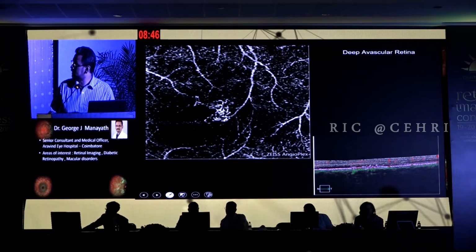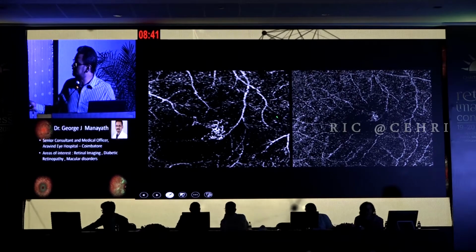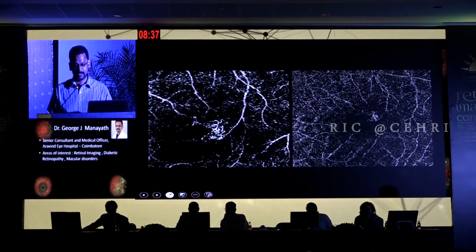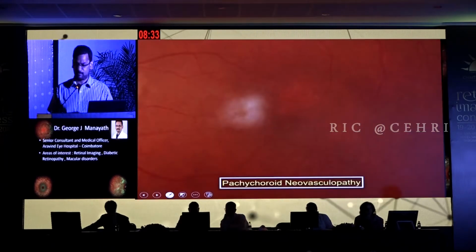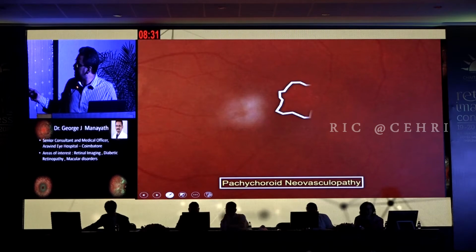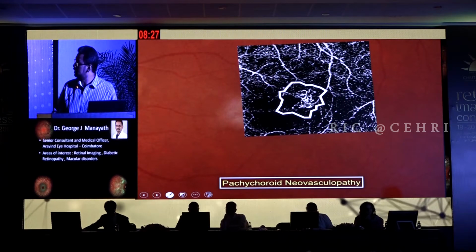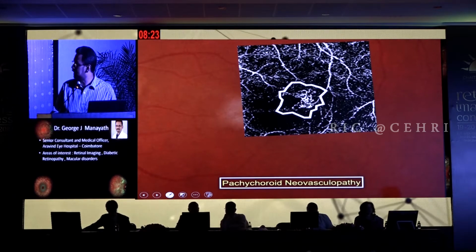The avascular retina shows this choroidal neovascular membrane, and these are 3 mm and 6 mm slabs of OCTA showing this network there. And when you overlap that flat irregular PED to this OCT angiography, this is a pachyneovasculopathy overlying a pachyvessel and attenuated choriocapillaris, and the patient underwent treatment with anti-VEGF injection.